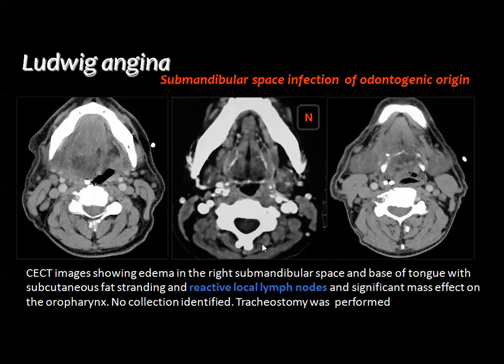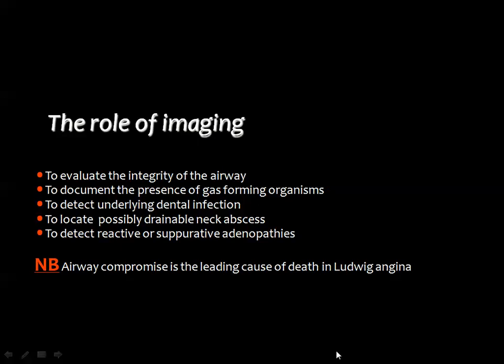Then this is the normal section, just to compare the clearly identified muscles and fat planes with this appearance of Ludwig angina.